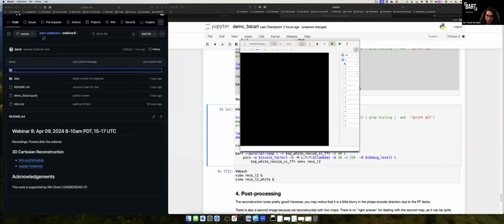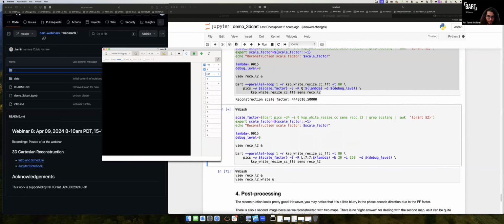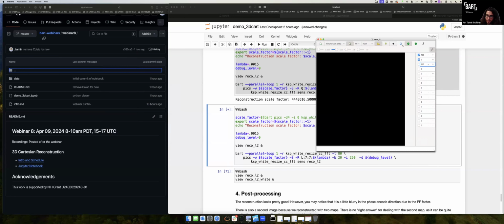Sometimes demos don't work when you do it live. Off script. Let's see what's happening here. Okay, not doing what I was hoping for.